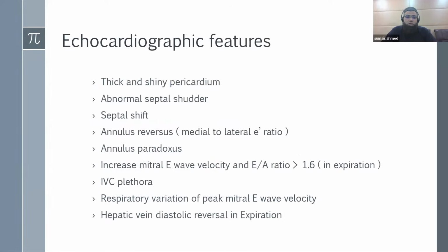Just briefly summarizing what we basically see in the echo. I will also discuss each of these points separately to build a great concept of constrictive pericarditis.